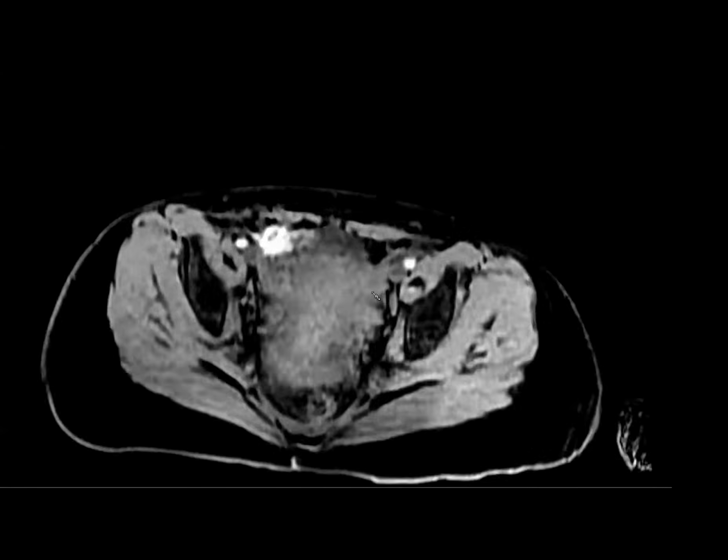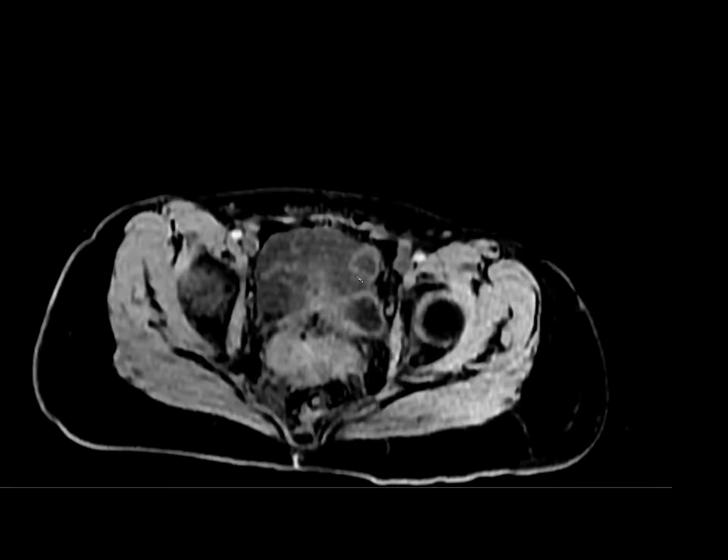Okay. Cool. So this might be a viable tumor, ovary. Yeah, I would probably call that MOE at this point, massive ovarian edema, especially if she's still hanging out, doing okay with it. Yeah. Cool. Okay. And then just a couple of points.